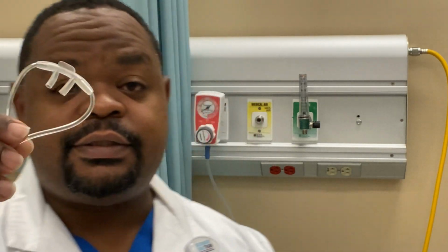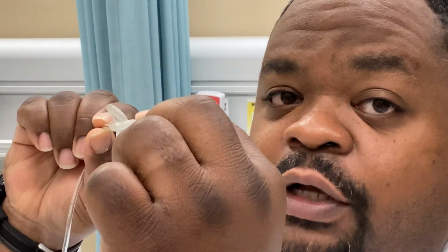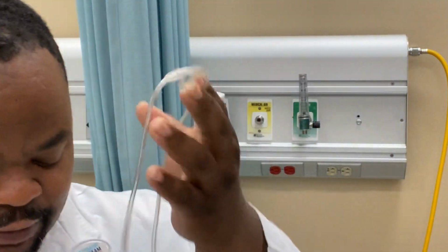If they're a little hypoxic and need a little oxygen, then we start them out with a nasal cannula, all right? This is the nasal cannula. See that? It has the nasal prongs. See how it hooks? This goes toward the patient, right? You want the hooks to go toward you, like going down into the patient, okay? They're gonna hook toward the patient, like a snake, right?